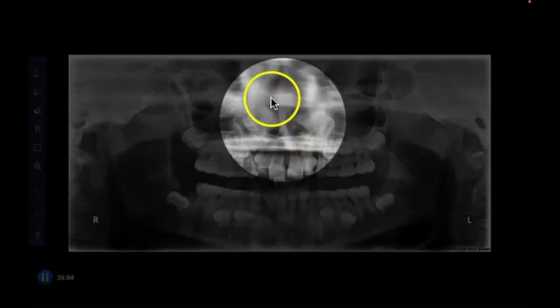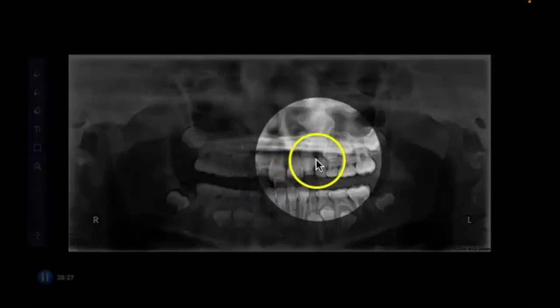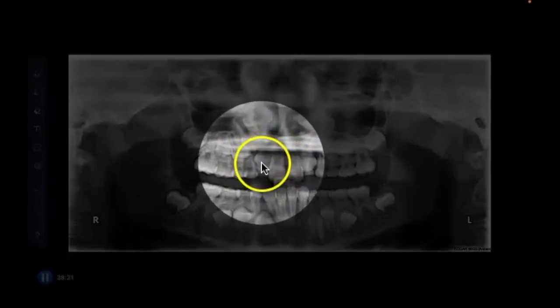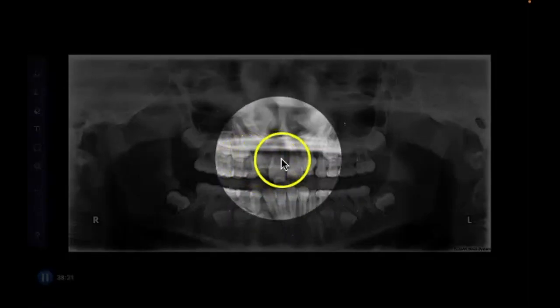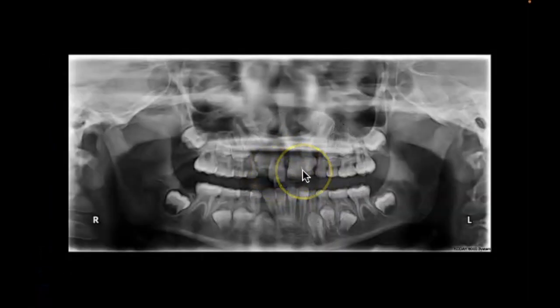Okay, there's some lower fives, but let's stick up here with the canines. So we have a lack of space for these canines. We mentioned one of the reasons is a small upper jaw, but what else can we see now? And magnification may affect it a little bit, but what else can we see now that might contribute to having more crowding than we thought we had when we were just looking in the mouth? Yeah, I mean, they look kind of big. So now again, it could just be that these are more palatal, but probably not, right? I mean, that's quite a bit of magnification. I mean, they look bigger than the centrals. Now, they probably aren't actually bigger than the centrals.